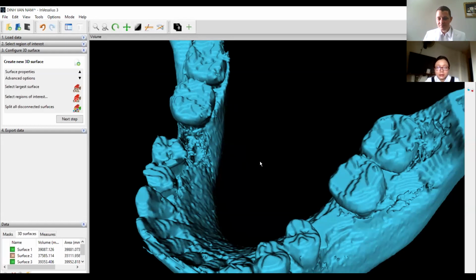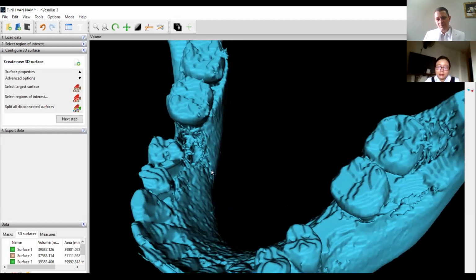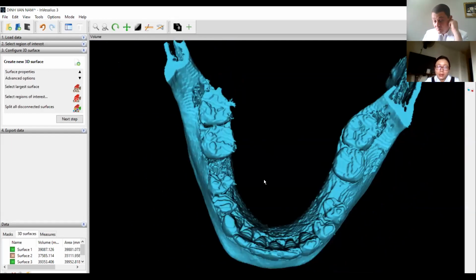Nếu mà giả sử như mình muốn có một cái mẫu hàm mà nó đẹp đó, thì mình có thể là chọn hết cái lát cắt, chứ mình không có chọn 1 bỏ 1 hoặc là chọn 1 bỏ 3 chẳng hạn. Thì thường thì những người mà làm cái phần mềm này á, là những người mà làm implant toàn hàm, tức là all on 4 hoặc all on 6 á.